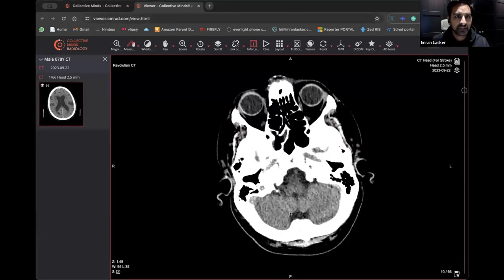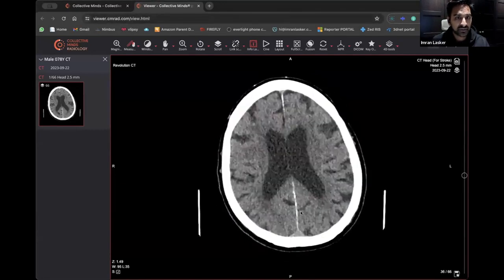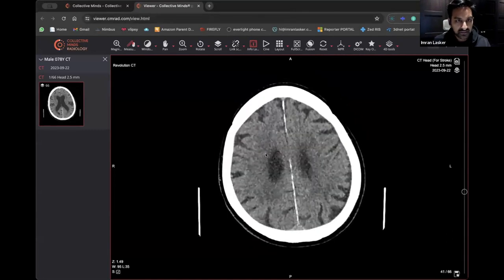This can be a bit challenging, because subdural hematomas are usually crescent-shaped. So let's get rid of that. A crescent shape should be like a crescent moon, right? Like this. And an extradural hematoma is going to be like this, right? Someone actually told me that one looks like a banana and one looks like a lemon, right? So I guess a banana would be the subdural hematoma and the lemon would be the extradural. Now, my mind still can't work with that.